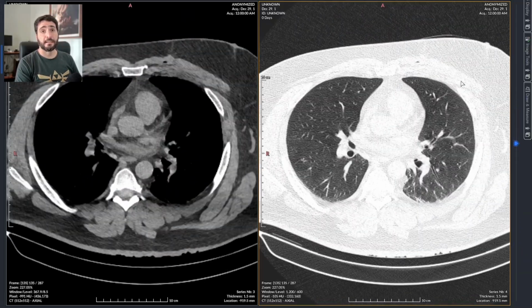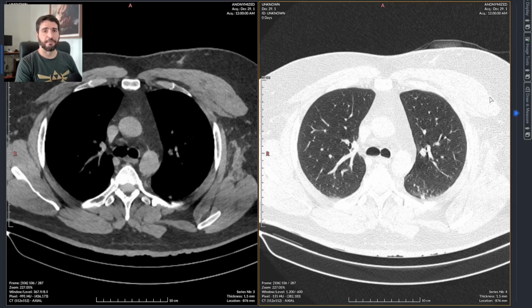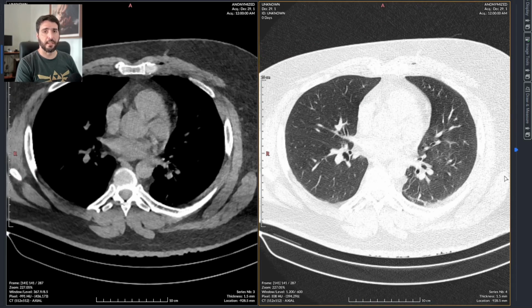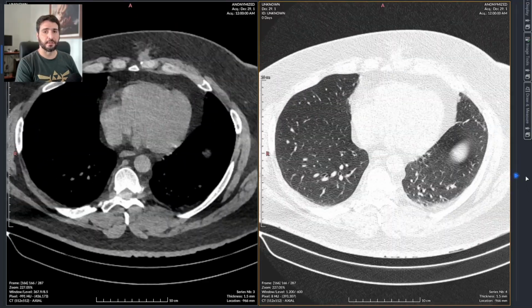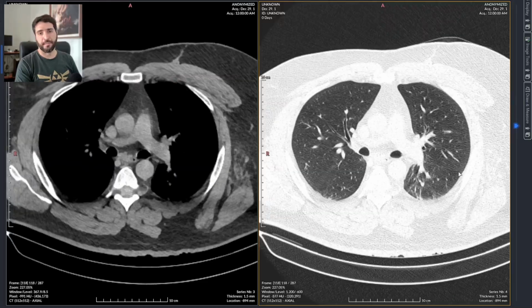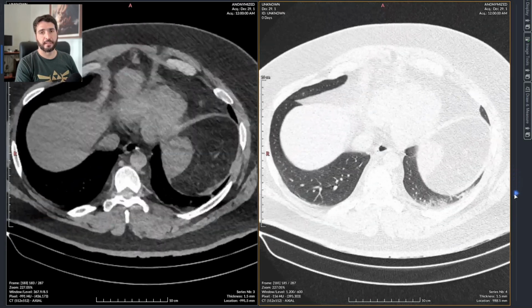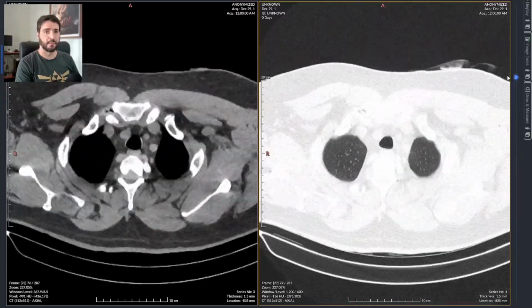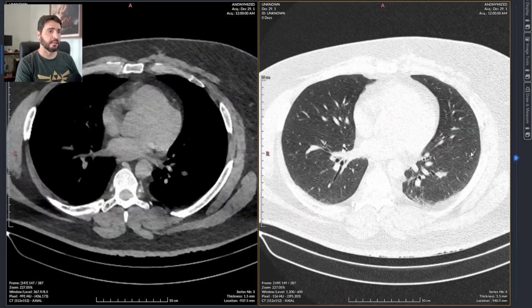And as he is majorly injured on his left side, when he breathes in, he can't really expand the left lung as much as the right lung. So he gets this kind of image pattern in his left lung. This kind of atelectasis is pretty common. It's not significant to the diagnosis itself.